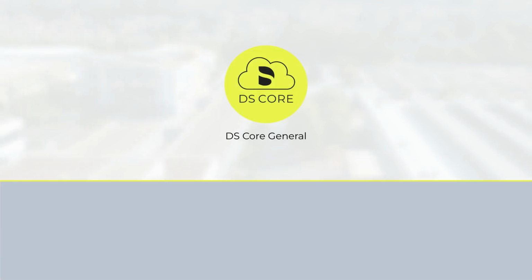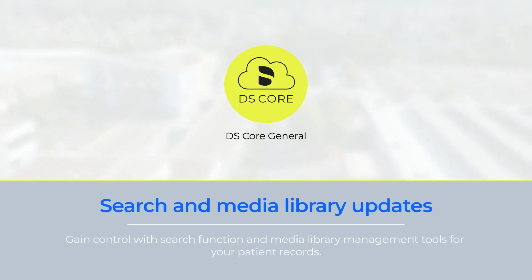In this tutorial, you will learn about some exciting new possibilities that support you to manage your patient list and media gallery with ease.